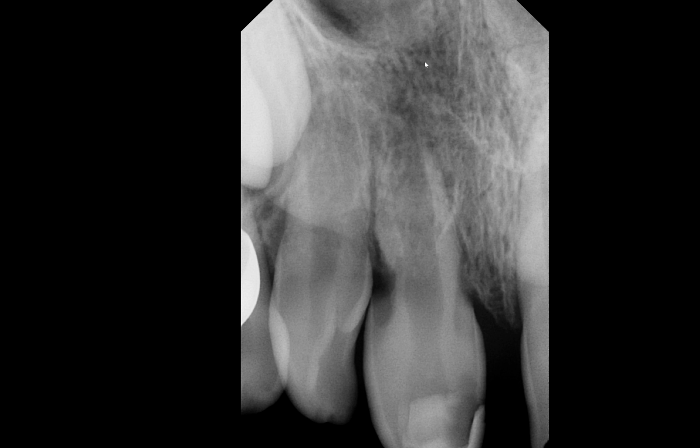Look at this radiolucent area. Yes, we do have normal anatomy that we have to account for, which is the nasopalatine foramen, which is approximately located here. But this radiolucent area, while we see a trabecular bone pattern, is most likely due to the intrusion, and the bone had to remodel again once this tooth extruded.